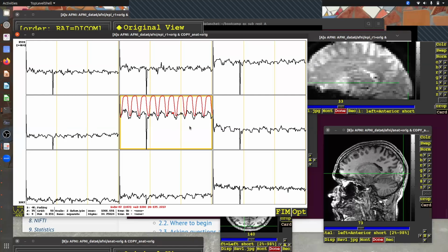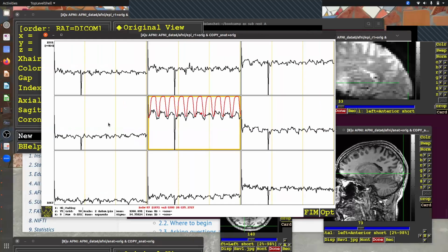Whatever you're doing for your data processing, it is nice to start off by getting to know your data a little bit in the beginning and see, do things make sense? Are there weird features here? There are weird features here, the spike. We can understand it and we'll try to account for it in our processing. Actually, we've seen two spikes so far. The one in the beginning that's always up, and we'll deal with that. And then this one that occurs during the time series, and we'll try to deal with that.